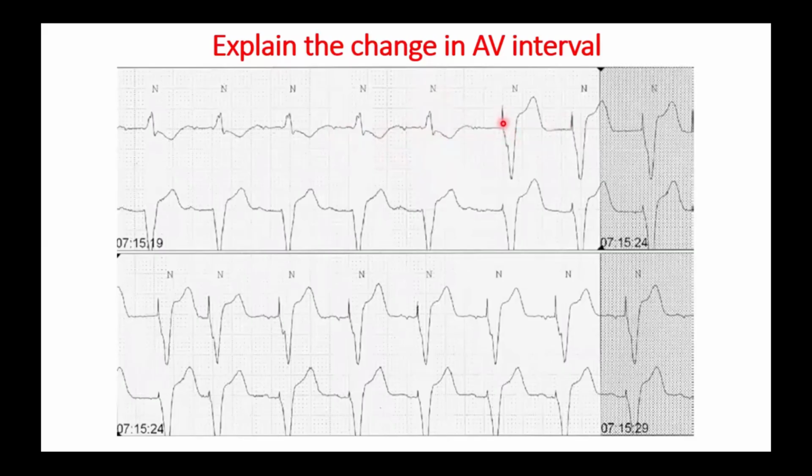Once there is no conduction, V pacing occurs for some beats, then it shortens and returns to the sensed AV interval. And once spontaneous ventricular activity is sensed again, the AV interval is prolonged to the new value. Is it clear? Is this search AV hysteresis? Yes, this is.